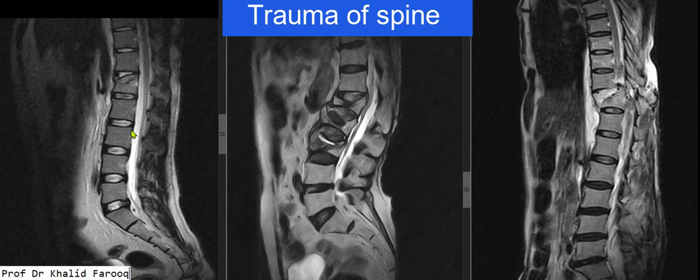This is a young patient, 25 years old, having mild superior end plate compression fracture. Surrounding soft tissue is unremarkable. Bony canal is capacious with normal cord and conus. This is 75 years old patient showing multiple osteoporotic compression fractures. These are old injuries. Surrounding soft tissue is unremarkable.